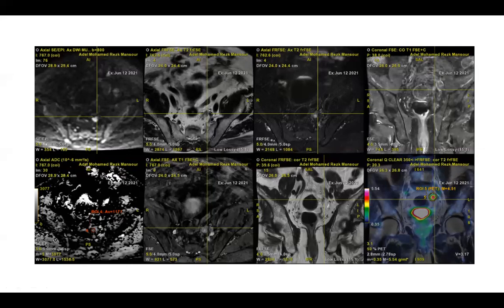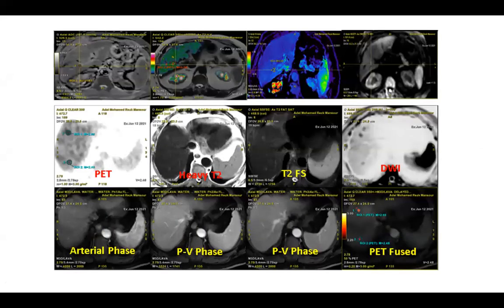What was interesting in this case is that we not only found this solitary lymph node that is acquiring PET MR features of active neoplastic involvement, but there was also involvement of the liver through these metastatic hypo-enhancing lesions, which were standing out as focal areas of diffusion restriction.